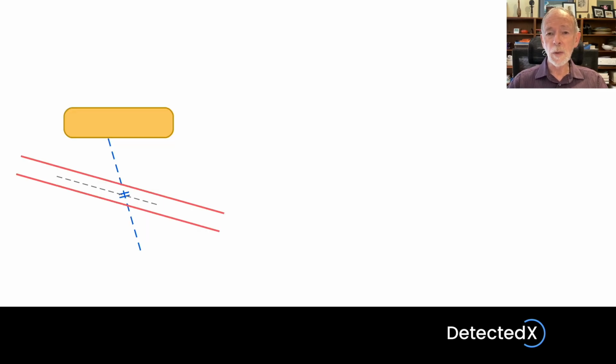As usual, it relates to assumptions and idealizations that are necessary in order to make the measurement. On the left-hand side, we see what's displayed on the screen. We have the probe, we have the beam indicated with a single straight line, we have the sample volume sitting in the selected point, in this case in the center of a vessel, and then we have the flow direction, which the user indicates with the angle cursor. The machine then calculates the angle between the flow direction and that beam, and it therefore knows the Doppler angle.